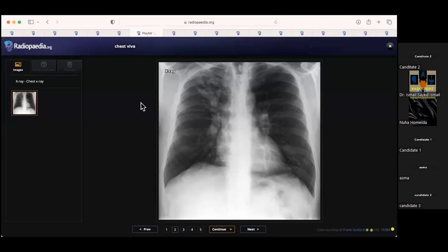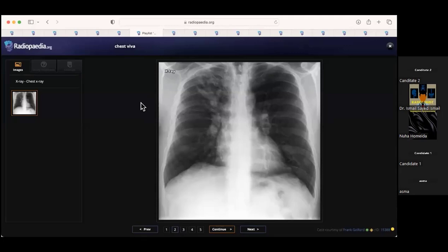So I'm presented with a frontal chest radiograph for an adult who presented with shortness of breath. The most striking abnormality is tubular branching opacity projecting over the right upper lung zone. There is slight loss of volume of the right upper lung zone compared to the contralateral side. There is no evidence of pleural effusion, no pneumothorax, and the left lung appears clear. Heart size is within normal. There is minimal fullness seen at the hilar regions bilaterally, but no convincing lymph node enlargement.